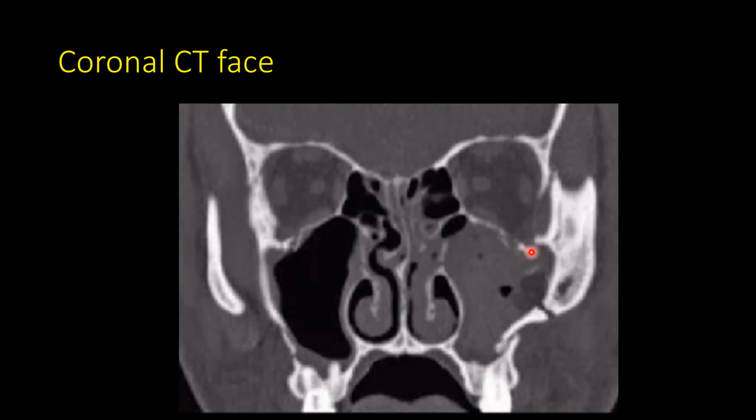So you can see that part of the bone is out of the orbit and has gone inferior. So there is a complex maxillofacial orbital fracture which contains also a blowout fracture. So this is a complex fracture, okay, with hemosinus.